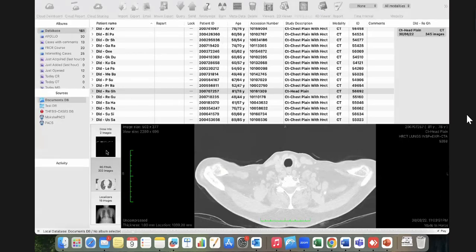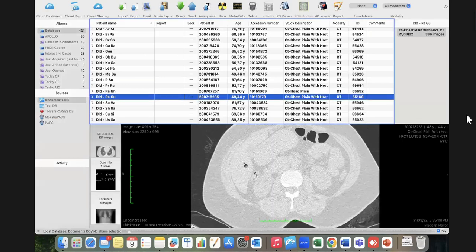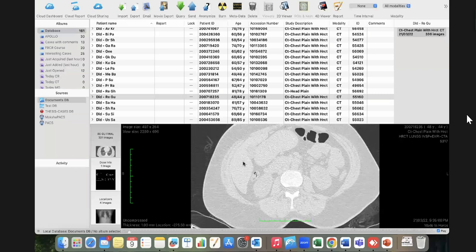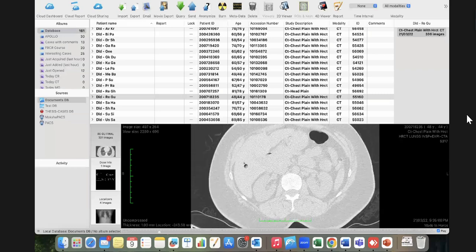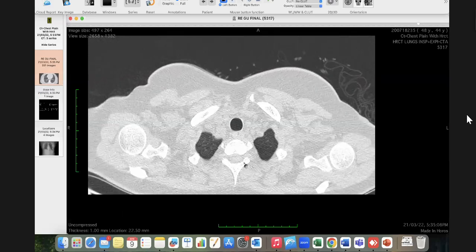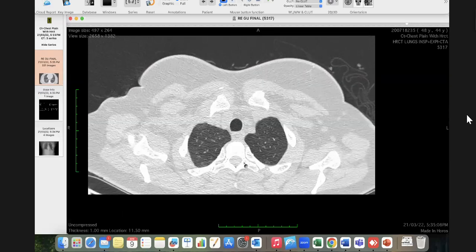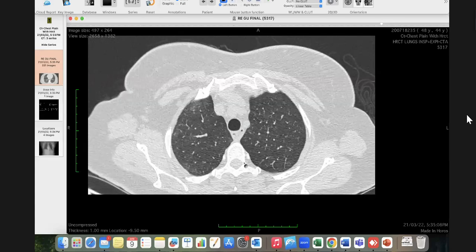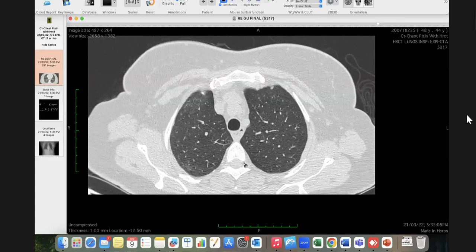So this, as I said, is a 44-year-old lady, and I am again scrolling from top to below. Nothing much, but what am I seeing here?